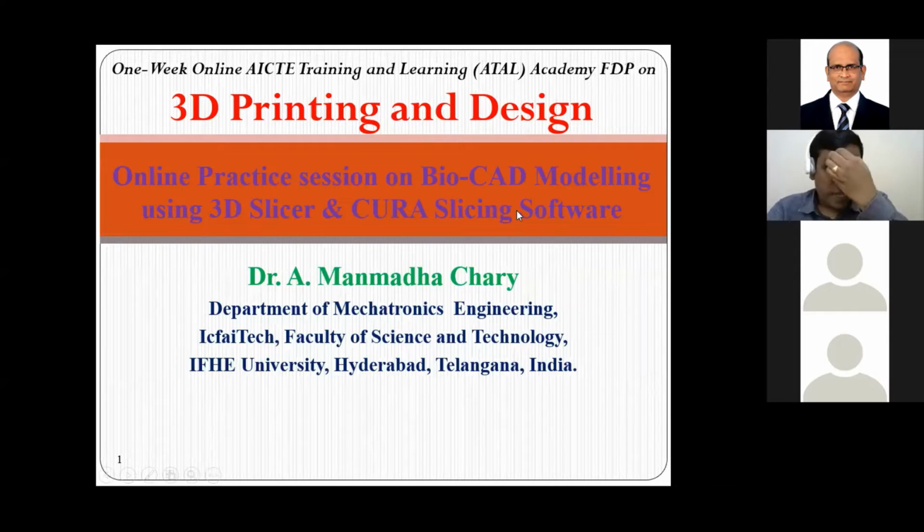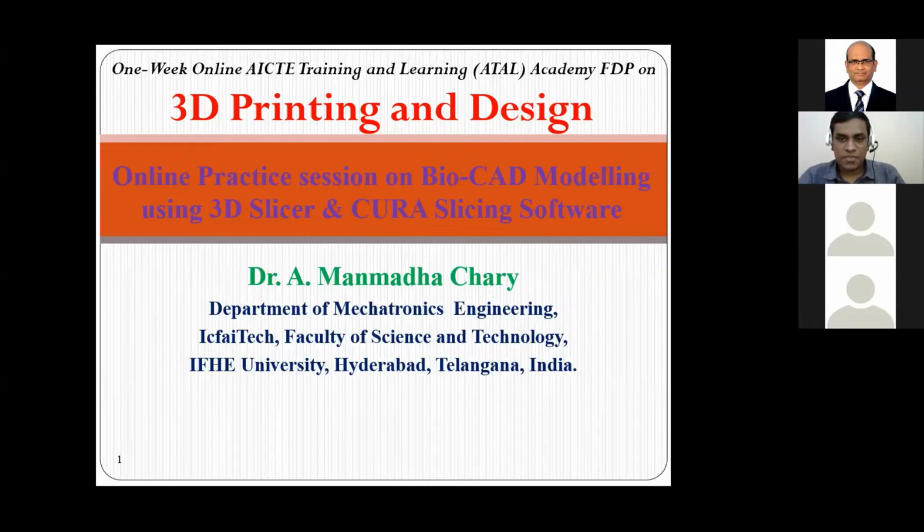Today I'm giving a demonstration on Bio-CAD modeling. We are going to develop a Bio-CAD model using 3D Slicer, and then develop slicing models. That means after converting to an STL file, we develop slicing data, which we give to the additive manufacturing machines. In this session, we are going to practice two software: one is 3D Slicer and the other is CURA.